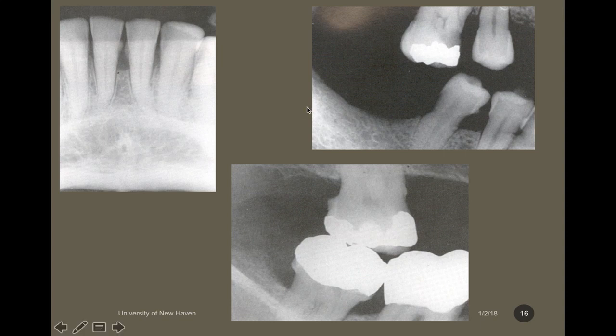Over up here on this radiograph, I have the same thing. I can see large areas of calculus deposits and more bone loss. This looks a little bit more like case 3 to me. And maybe up here, maybe some case 4. Again, this maybe should be a vertical bite wing, so I could see more of the bone loss up on the top here.